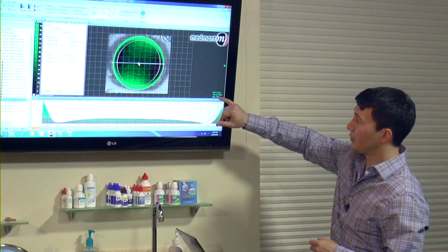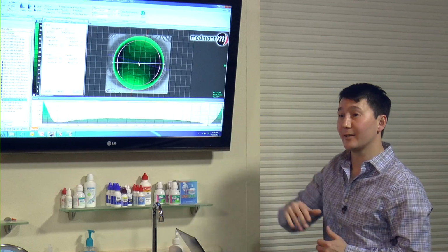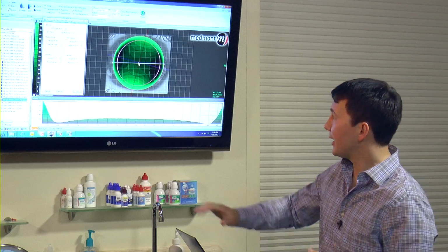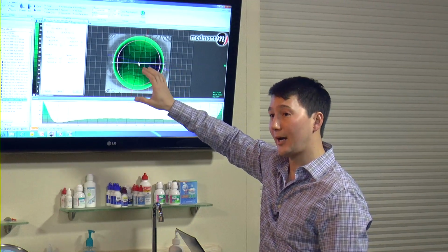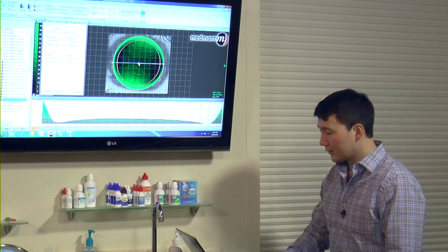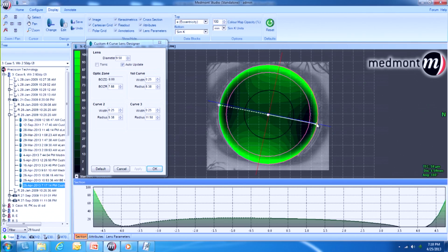And when I click my cursor in the center, it says we have 22 microns of fluid underneath that lens. What did we say was our minimum threshold to see fluorescein? 20, right? So we've now met that threshold. If we were to drop this lens on eye, it should have some visibility of fluid, of fluorescein molecules under the center. So this is good. Now the next question is, we've cleared the corneal apex appropriately, but where does the lens land or bear?